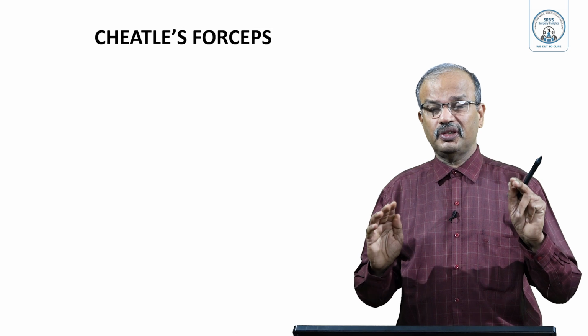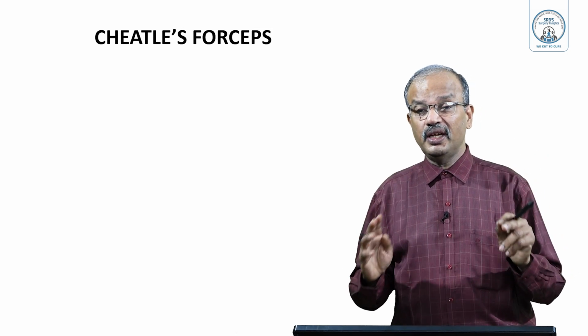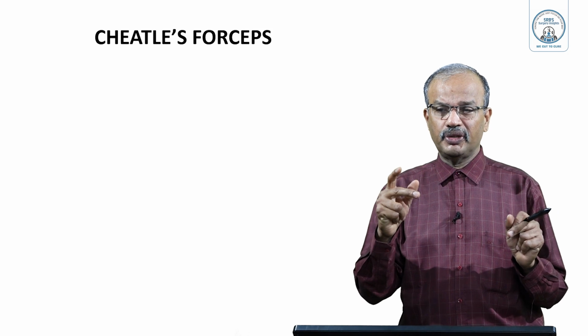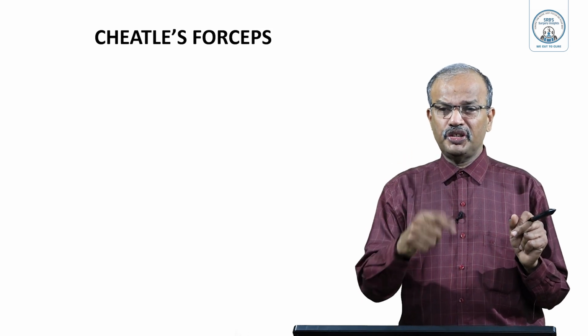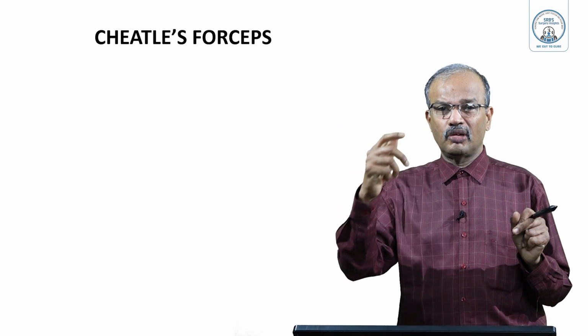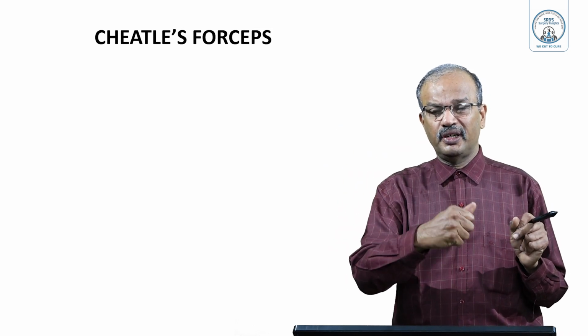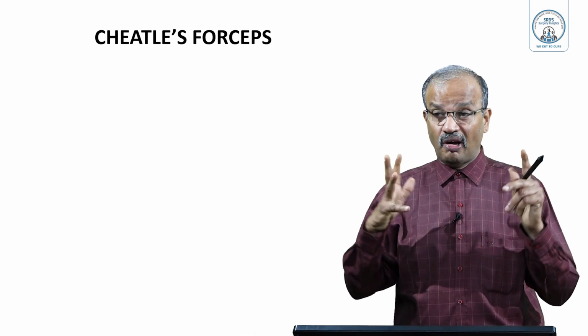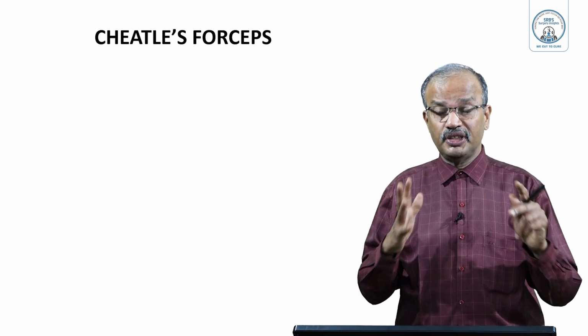Cheetle forceps is the one which is used in the OT to hold. It's a very stout instrument without lock, to hold the sterile instrument and bring it from one table to the other, or bring from the sterile tray table to the OT table whenever the surgeon asks. So to transfer the sterile instrument, this instrument is used.